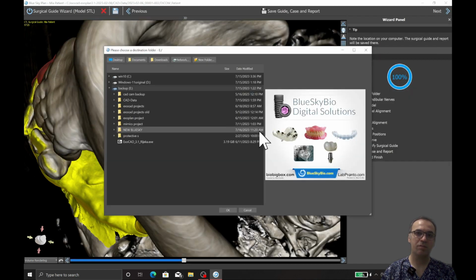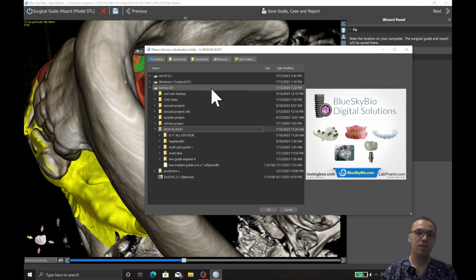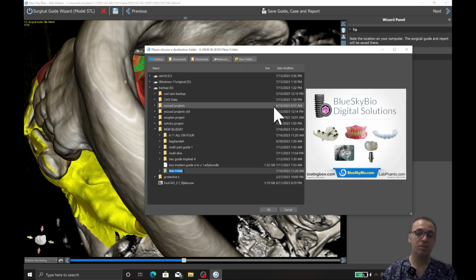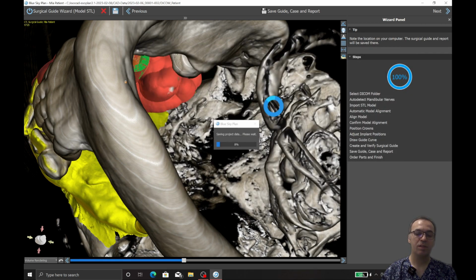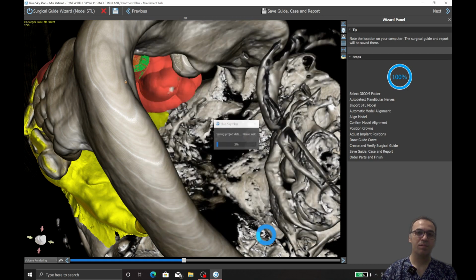I kind of agree, but in case I'm not using soft tissue, this guide will be so fragile. So I use a little bit, not for having support from soft tissue, just for having enough strength.